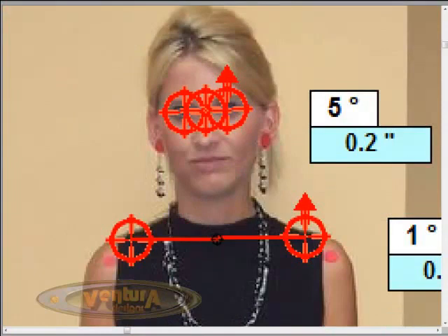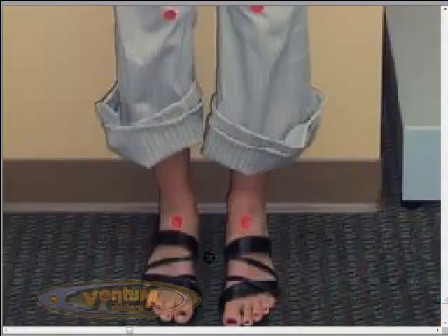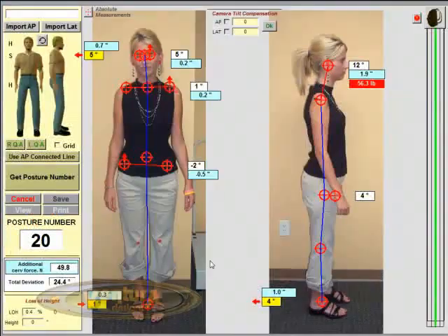If you follow the middle of the neck down to where it attaches to the sternum, that's the episternal notch. You click on that. The third click is the belly button, and the fourth and final click is right between the feet on the floor. And that generates a blue plumb line on the facing view.